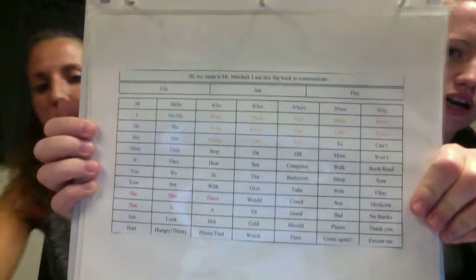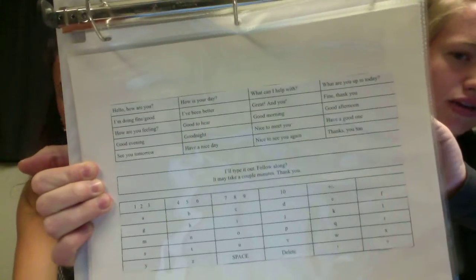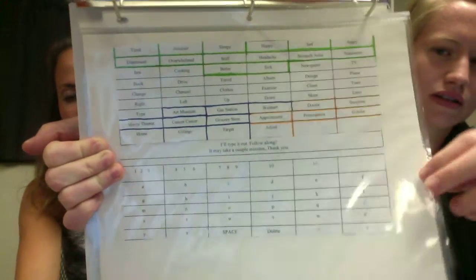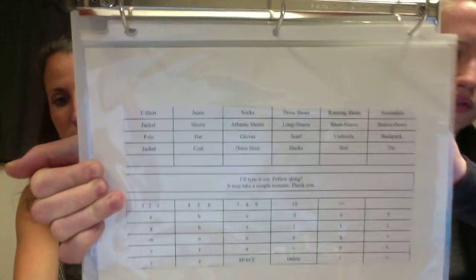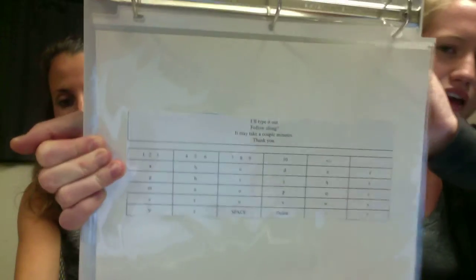I'm just going to quickly go through and hold up close what our board looks like page by page, and then we'll start talking about it. So here's the first page, some core words, and then the second page, we get into greetings and a keyboard. Third page, some fringe starts, more fringe with the keyboard. The keyboard's alphabetical for ease, and the last page is just a keyboard.